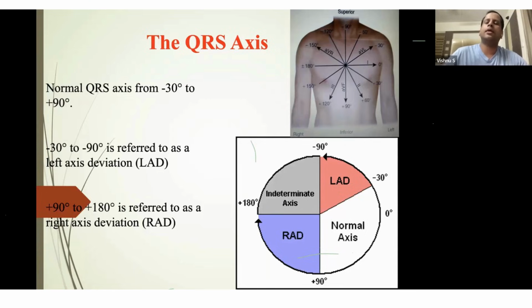So you can see the net activation front of the heart and find how it is activated. Why it is important: we can localize the ventricular tachycardia by seeing this QRS vector. That's important. Left axis deviation, right axis deviation, normal axis, and also some MI, anterior MI. If right axis deviation is there, then more of the myocardium on the left side is lost.